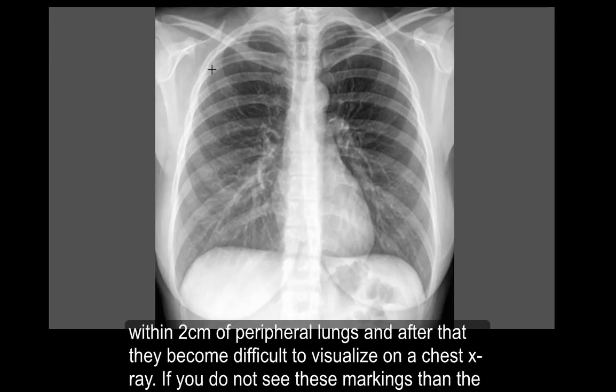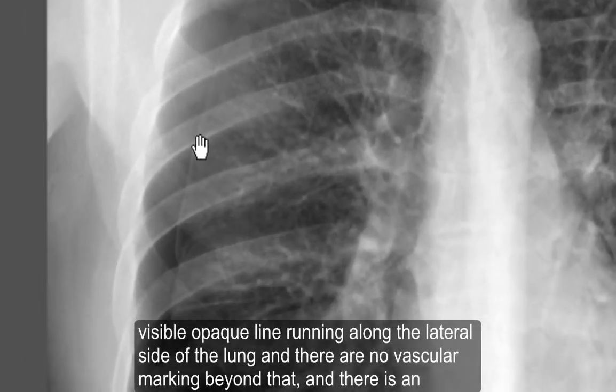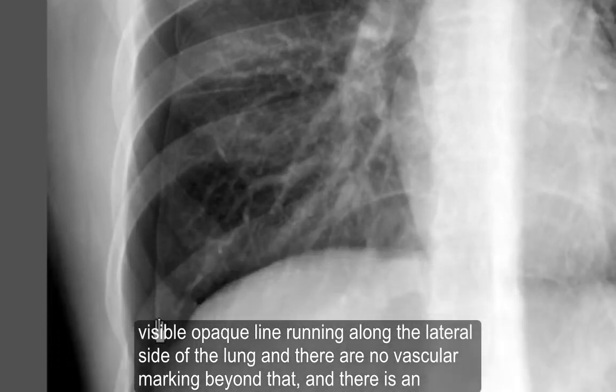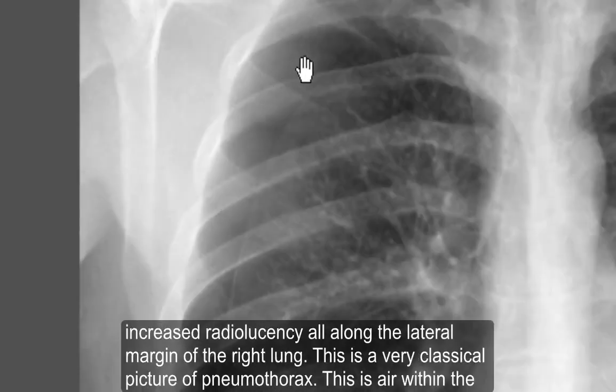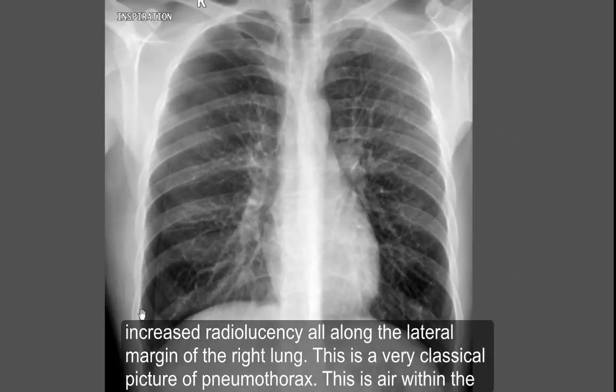Now you should see these markings up to within 2 centimeters of the peripheral lungs, and after that they become difficult to visualize on a chest x-ray. If you don't see these markings, then the x-ray is not normal. Okay, on this x-ray we can see a very thin but distinctly visible opaque line running along the lateral side of the lung, and there are no vascular markings beyond that line, and there is increased lucency all along the lateral margin of the right lung. This is a very classical picture of pneumothorax.